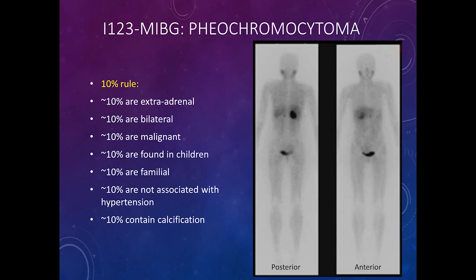So good that it's not on the exam to ask you what kind of radiopharmaceutical it is. But you can clearly see on the posterior view that there is a big mass in the region of the right adrenal gland, and it shows very high uptake of radiotracer, which clearly exceeds uptake in the liver, so it's abnormal. It's consistent with pheochromocytoma. And you can see on the posterior view on the left side, there is uptake probably in normal adrenal glands. That's how uptake in normal adrenals usually looks in adults.